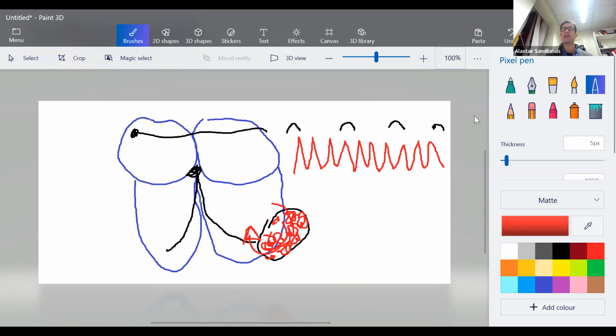Okay, so let's put them together to make up V1. And so you've got to imagine now that the P wave is, this one is in there, so you're not going to see it. That one's at the beginning, so you might just see it here. This one's in there, so you might see it in there, and you might get the tail end of that one.